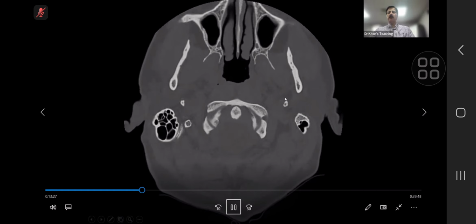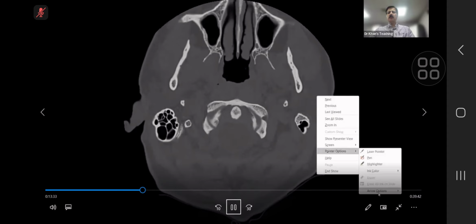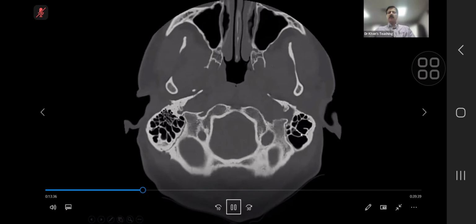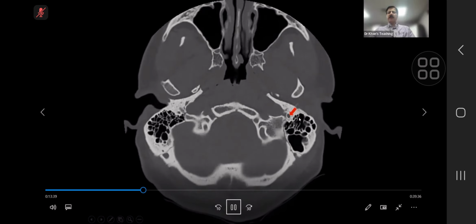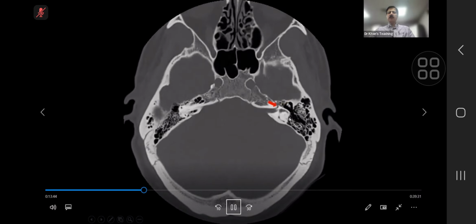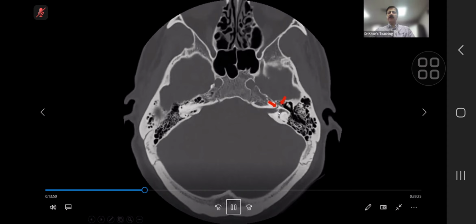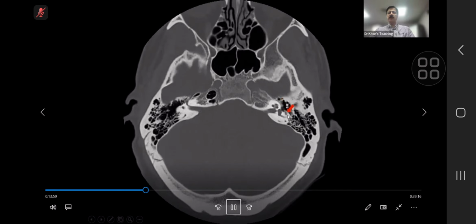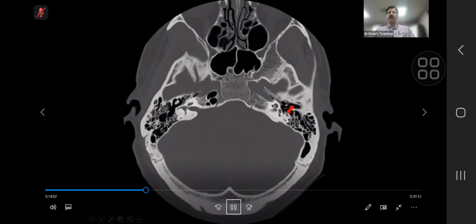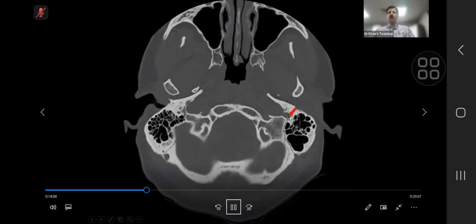You can imagine that the parotid gland must be sitting here. Let's track the facial nerve once again. This is the cochlea. We go superior to the level of the cochlea, and we can see the nerve coming from the internal auditory canal, going anteriorly, and then the tympanic portion goes posteriorly, and then it becomes a ring because we are seeing it end on. It is descending down, and ultimately it goes out.